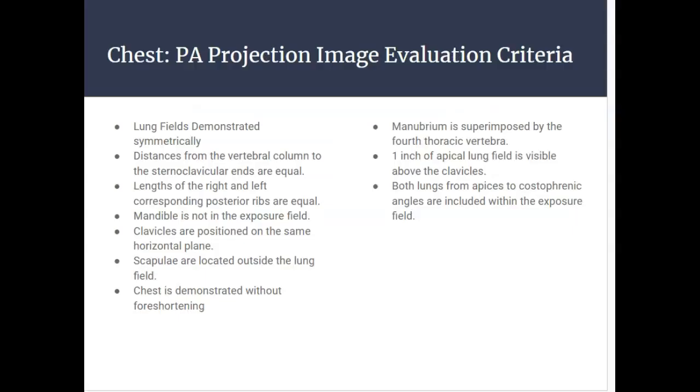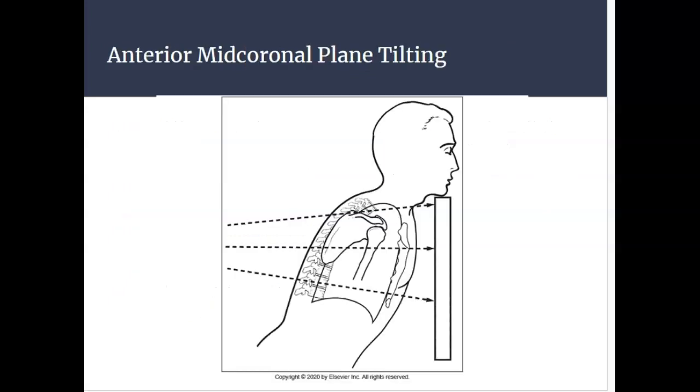In this presentation, I have provided you the image analysis evaluation guidelines. Also, they are on the Google slide presentation that I have provided you within this module as well. So let's talk about some positioning errors with mid-coronal plane tilting.